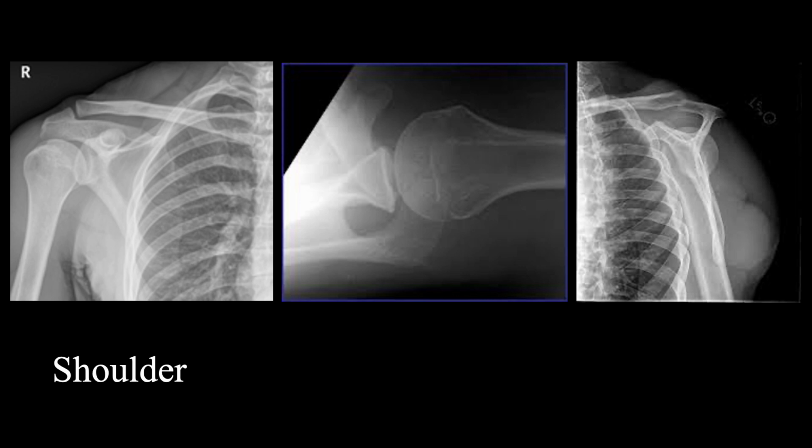Again, here really quick, you can look center. So the coracoid. On this view here, the axillary, the coracoid is called the lighthouse of the shoulder. That is anterior. So you can always tell which way is anterior because you'll see the coracoid. Something to keep in mind.